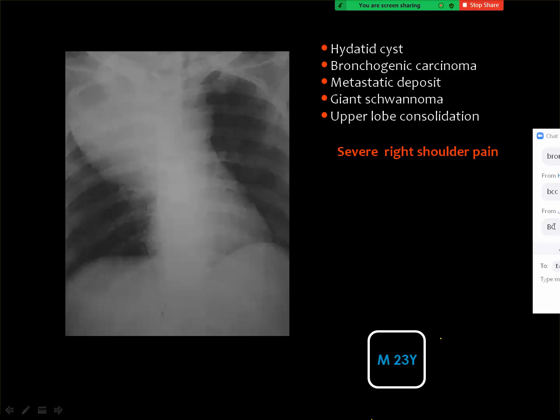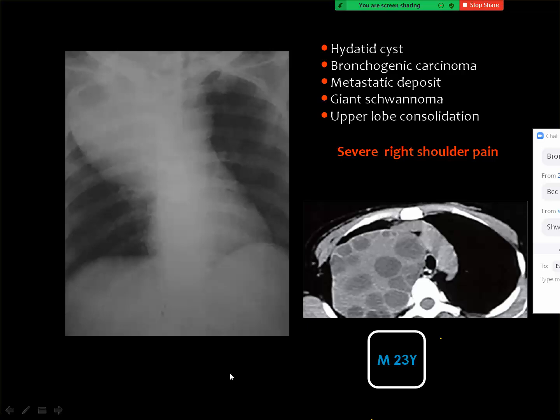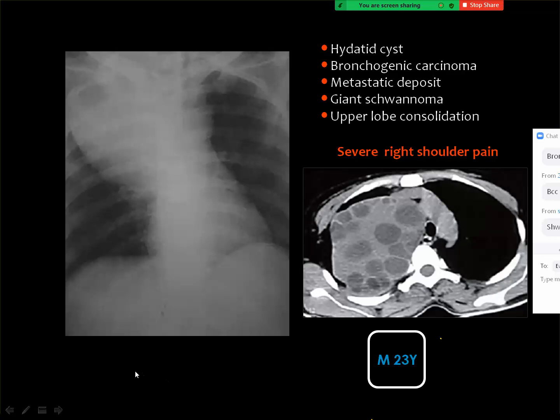Bronchogenic carcinoma, you should look carefully for the ribs, and this is very important. If you see some rib erosions or destructions, you may think so. And according to the rules I have given in the lectures, if you see a mass in an adult, you think of a bronchogenic carcinoma until proved otherwise. And this needs verification by CT.